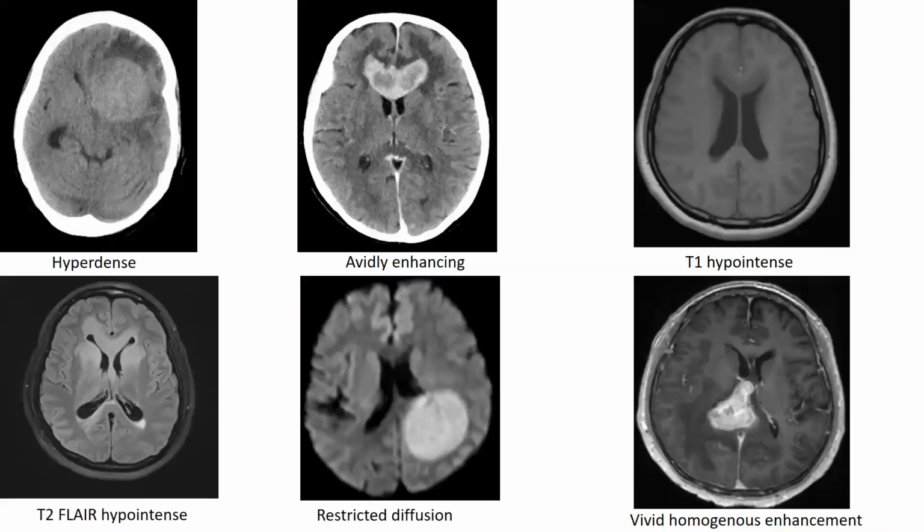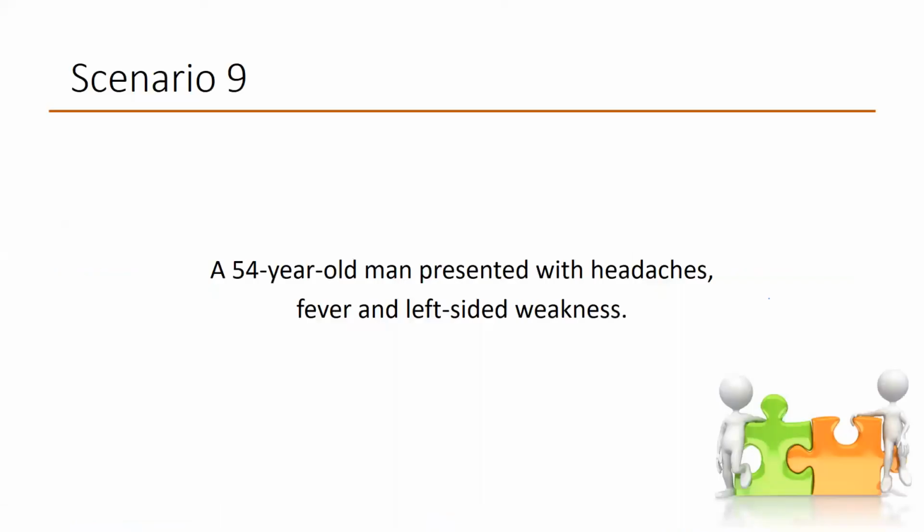So keep these images in your mind, and you will be easily able to identify whether it is a lymphoma or not. Always there can be lymphoma, there can be close mimickers. Biopsy is definitely needed. Without that, we cannot proceed.